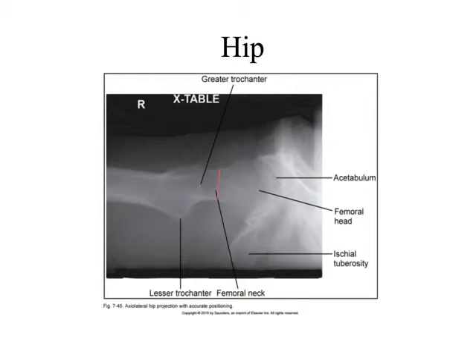These patients, it seems like, are seldom asthenic patients. So the proximal femur now is what we're going to be looking at for our technique. When I see this image, I know immediately I'm not interested in what's going on with contrast and density in terms of musculature, right? The technique is going to be such that I'm not going to be able to capture any musculature and get sufficient density along the femur. So the femur now is the measure for my technique.